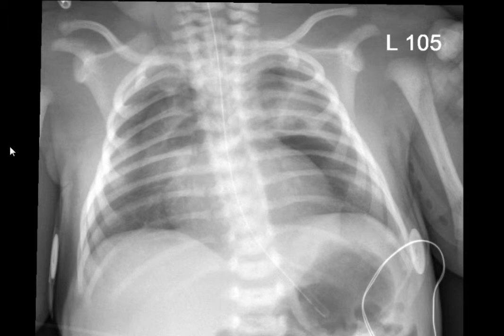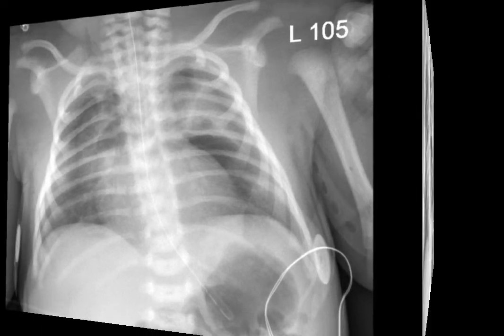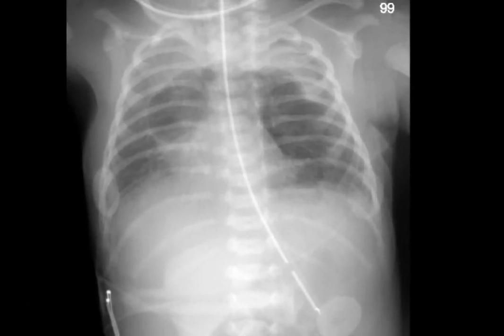Frequently, a pneumomediastinum and pneumothorax coexist, not in this particular case, nor does pneumomediastinum have all the serious implications that a pneumothorax can have. It should not lead to a tension phenomenon or increased pressures in the jugular venous system that may lead to an IVH. This is a more dramatic example of a large pneumomediastinum lifting the right lobe off of the heart, lifting the left lobe off of the heart, and I don't really see an associated pneumothorax here.